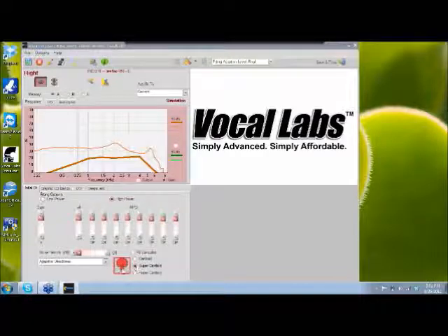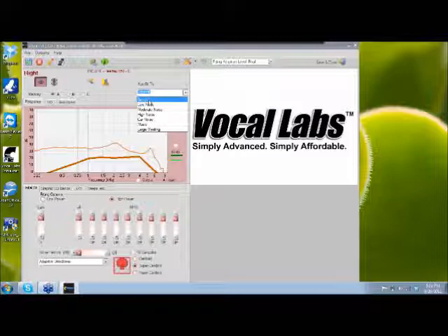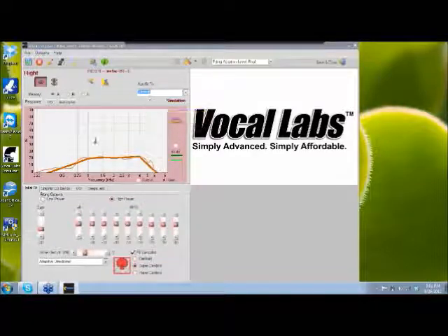And if the patient says when they come back in or for a checkup, hey, I'm getting too much behind myself, you can always switch it to the cardioid and give them mostly frontal, mostly all frontal. But for starting point, we'll start with a supercardioid plot. Now, we want to auto-fit our first memory, and we want to do it to a general auto-fit setting. So by dropping this auto-fit to box and clicking general, the software applies a general auto-fit to this memory.